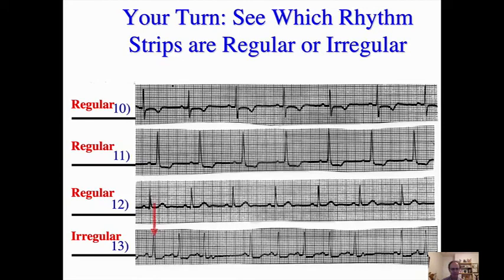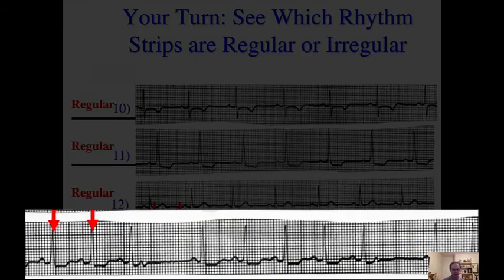That looks pretty interesting. So what you do, first establish your distance. There's cardiac cycle number 1, cardiac cycle number 2. All right, so you've used your envelope, your card, your folded paper. Now you just work down the entire rhythm strip. So I've locked this in place. All right, no difference there. Whoa, class, look at that. That's about 5, 6, 7, 8. That's almost 10 small boxes. Whoa, that is amazing. Yeah, all it needs is 1. That is irregular. But keep working down because we need to know this for our EKG interpretations later this semester.